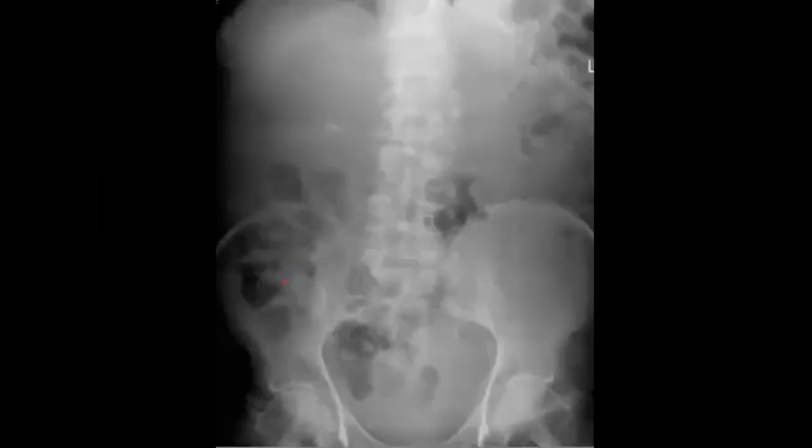It is more like the core cases in EDiR, and it's more like the long exam cases in the FRCR. Okay, this patient presents to you with acute on top of chronic abdominal pain. He's a 50 years old patient. You agree to the request and they did this abdominal plain radiograph. So what do you think?